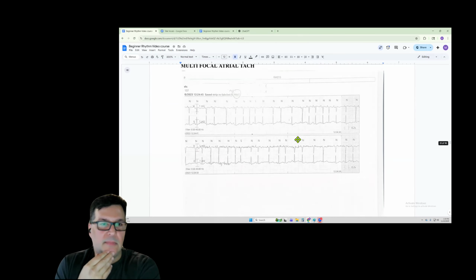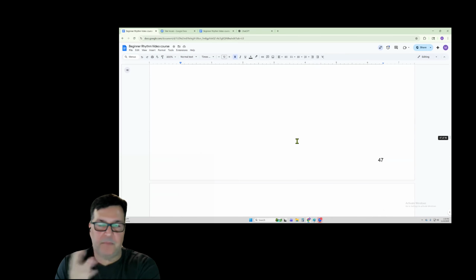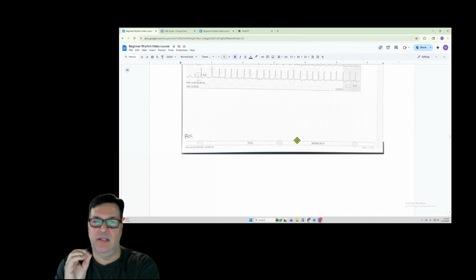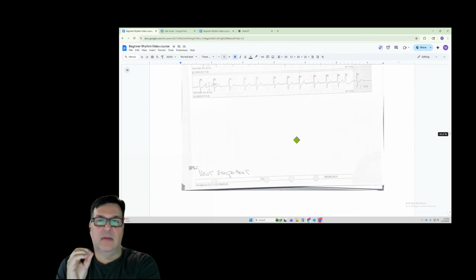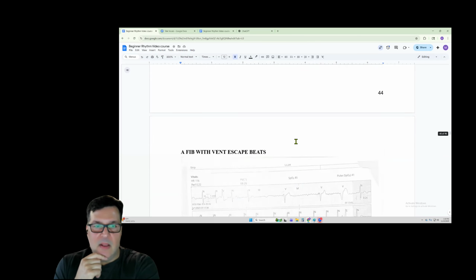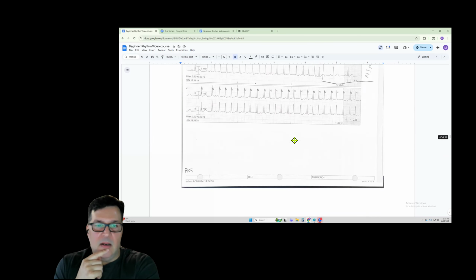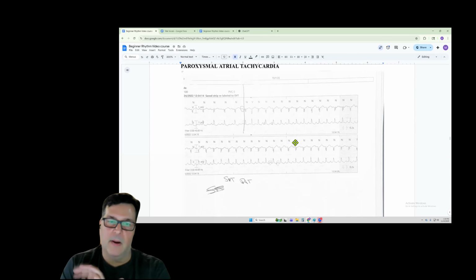You're fine, I'm taking notes though. You said tachycardia is just a bunch of PACs in a row? SVT, supraventricular tachycardia, is all a bunch of PACs in a row. Okay. Yes. Okay, let's use this one right here.